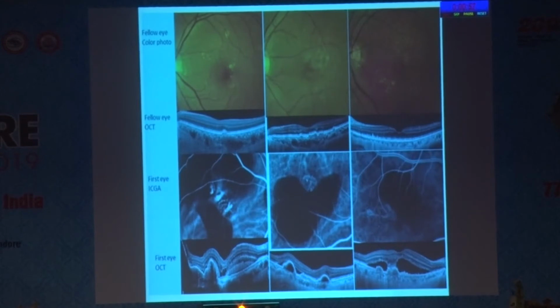So what is going to happen in the near future? You see the choroidal thickness. You have these drusen, and somebody would ask, this is the drusen that you have, and this is the choroidal thickness of that particular patient. So then retrospectively you can answer, okay, this could be the pachydrusen, this could be the pseudodrusen. In that way, I think we are going in a different direction to define the AMD going forward.